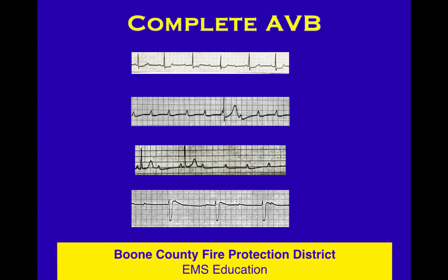I see a high-grade block down there. See all kinds of scary things that can happen. And so in every case, how do you attack these? You march out the P waves. March out the P waves. What's the ventricular rate? The first thing, is there a P for every QRS? Well, obviously not. There's dropped beats.